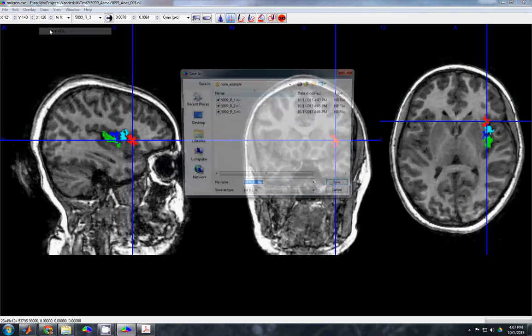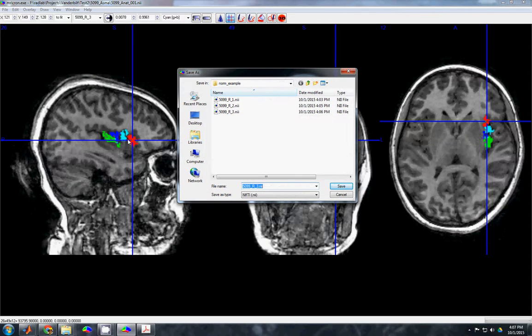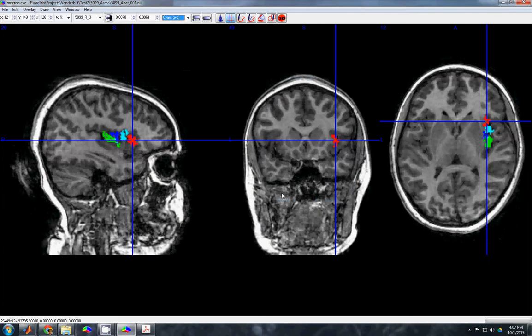Draw, save VOI. Remember, this would be our 4th image, but we're not going to actually get a 4. We're going to skip to 5, because 5 is going to be the most anterior of the dorsal ones, and we're not going to be able to fit 5 on top. So it's going to go 1, 2, 3, 5. So forget everything you learned in school about counting.